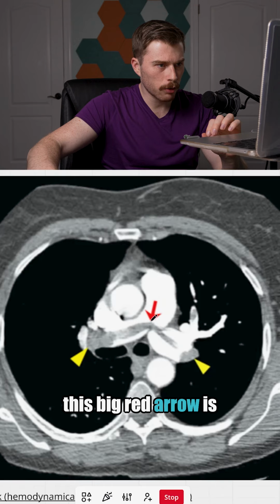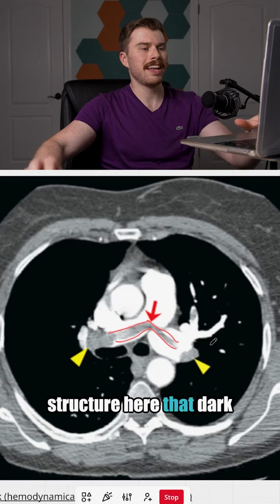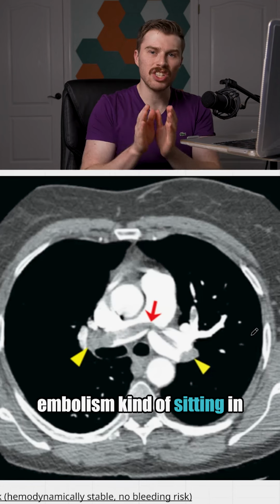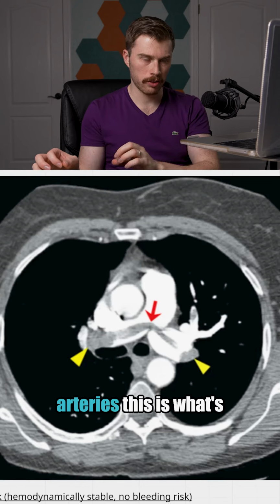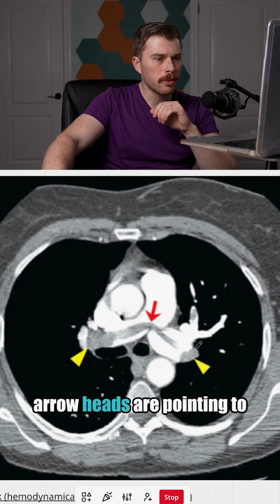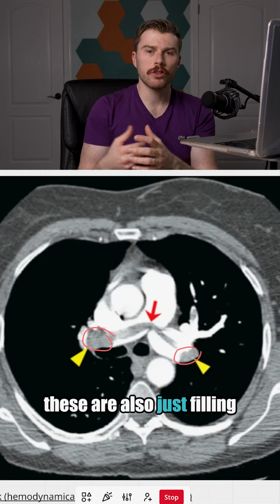This big red arrow is pointing to this bizarre structure here. That dark line is a pulmonary embolism kind of sitting in the wedge between the left and right pulmonary arteries. This is what's classically known as a saddle embolus. These arrowheads are pointing to these lucencies here. These are also just filling defects.